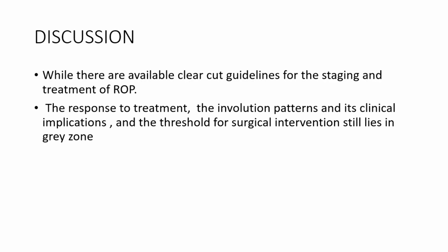It is just stretched up. It's like something has pulled it above. So the whole fibrous tissue is just pulled above the retina. Retina is flat underneath it, except for that right eye where you saw that superior thing. It's still not caused a TRD. Okay, and the macula is still not stretched. Macula is absolutely flat. And the eye grows. Remember, the maximum growth of the eye happens in the first month. The neonate grows the fastest, the eyeball grows fastest.